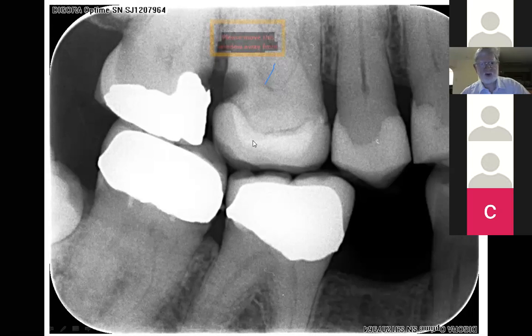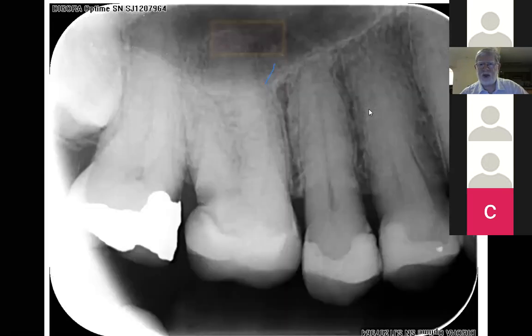And I spoke to a prosthodontist, and I said, listen, because I sent him the x-ray. So what I did is when I came to working on the 7, I looked at this tooth, and the occlusal part of that amalgam was huge. It covered a massive area. Part of the rim of tooth around the occlusal part of this amalgam was fairly thin. So I opted to preserve that and just to remove the MO portion.